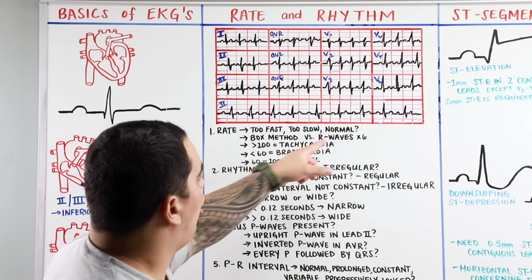How do I determine that? Again, if I were to really measure this, and we will look at this on 12-lead EKGs, we measure how many little boxes are between the QRS complex here. If there is greater than 3 small boxes within that QRS complex, that is considered to be wide. So if you remember, how many seconds is one little box? 0.04 seconds times 3, 0.12 seconds. So if it is greater than 0.12 seconds, it's wide. If it's less than that, we consider it narrow or maybe even indeterminate. We'll talk about that later, okay?